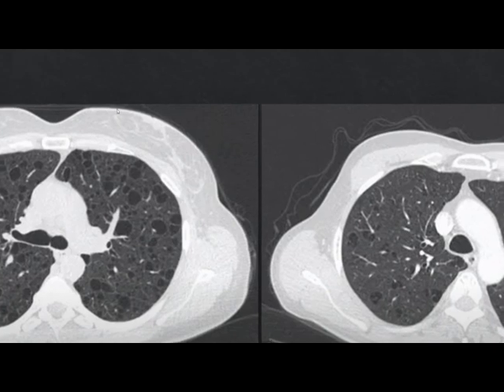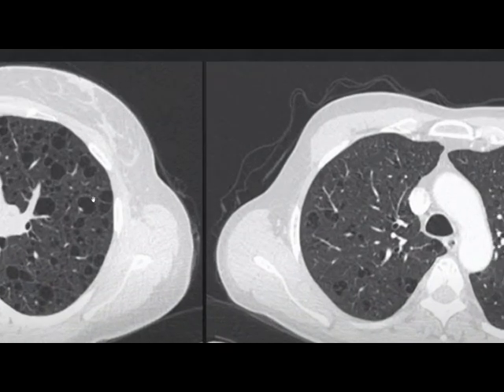Let us zoom a little bit. So as we can see, this cyst has a thin wall. It is completely air-filled, with some peripheral nodules. Those cysts have no wall and have some central dots. Those are representing lung cysts in a patient with lymphangioleiomyomatosis, and the cysts are typically thin-walled with completely air inside.